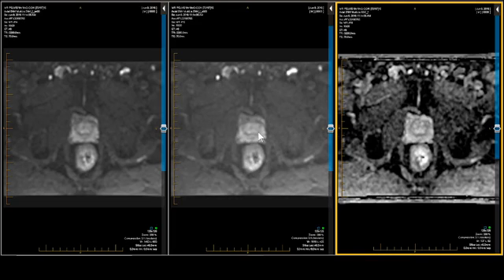We've already hit the major criteria for the TZ, which is the T2. No nodules, no masses, no erasure, no invasion. So this qualifies as a PIRADS 1.